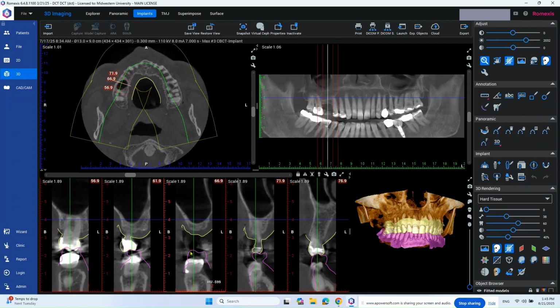Now you can see the opposing occlusal data that we brought in that's articulating with the upper. If you had this attached to the lower, it really wouldn't help you at all. Okay? But always remember, you still don't get occlusal data even by doing this. That's why you'd want to go back to CEREC and at least plan it in that plane. Okay, so let's go down here to implant.